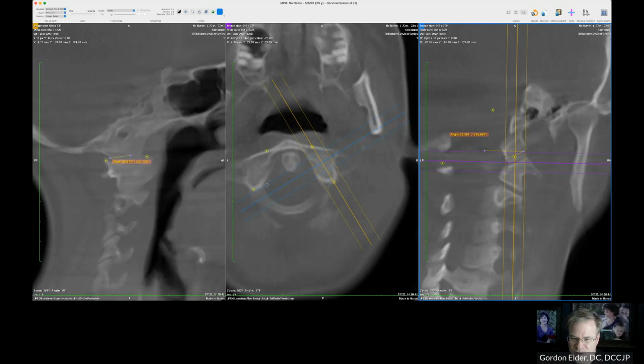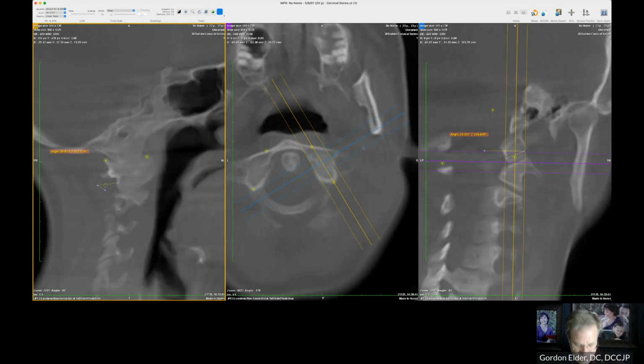In other words, if the view here was thicker, we'd be seeing the convexity, or at least how Dr. Blair did the convexity here, and we could measure the left convexity and the right slope. Well, it's actually a little bit more accurate, and it may not be necessary for our needs to be more accurate, but since it is more accurate, I measure the right slope and the right convexity at the same time.